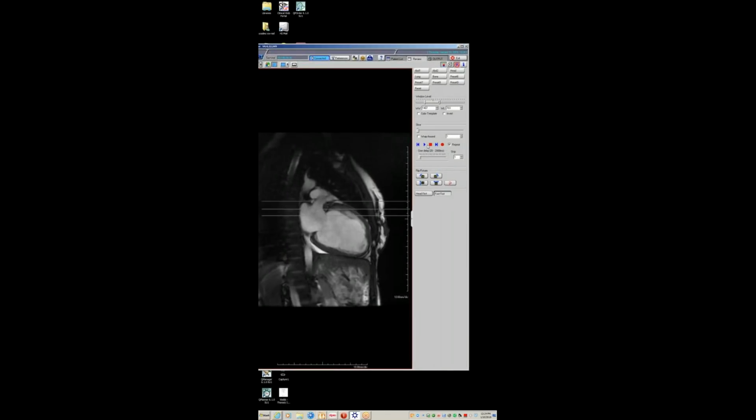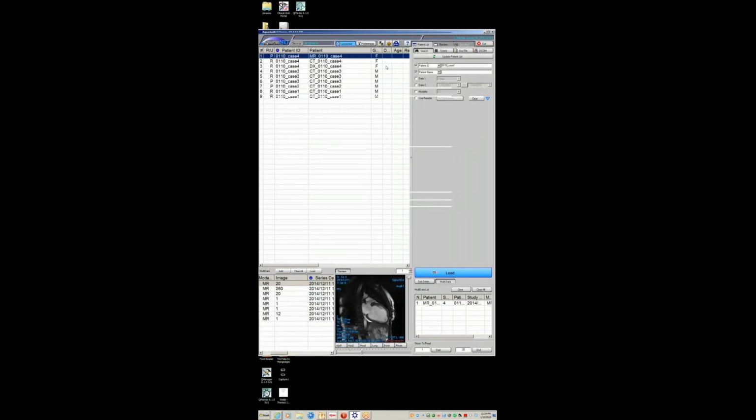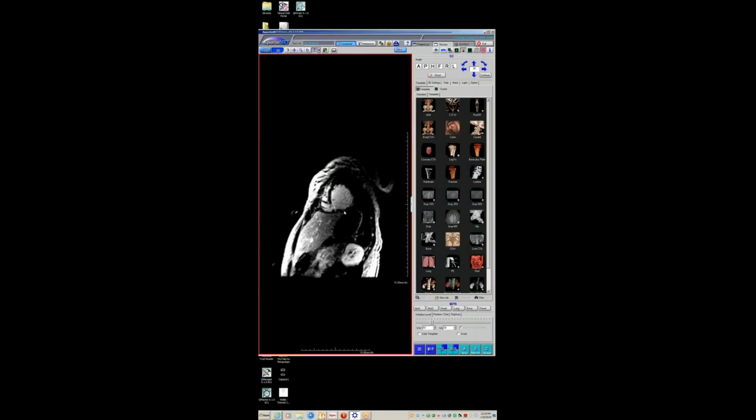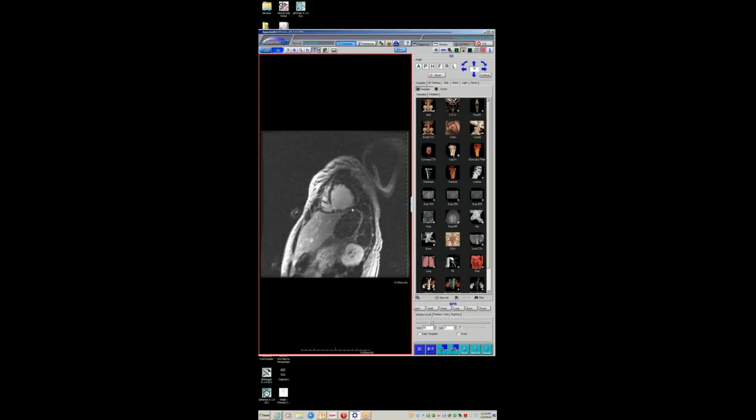And then this is just the MRI. I won't spend a lot of time on it, but interestingly, let's see if I can get this to work some way, and we can see the severely dilated left ventricle that is markedly hypokinetic. What was interesting on the delayeds was that not only is there a little thrombus in there, but she does have this little area of infarct. So, subendocardial infarct at the apex, where that little thrombus is sitting, and she had a normal cath.